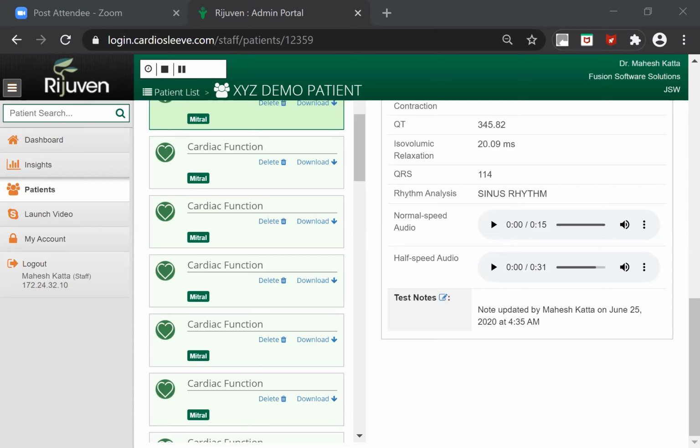Okay, and this is the cardiac function report: waveform, ECG, heart sound, and spectrogram. Then the spirometer, which is the lung function. This is a report for it. Okay, and the blood glucose report. Then the patient lipid panel report, urinalysis report, and the visual examination report. Okay, this is the report.